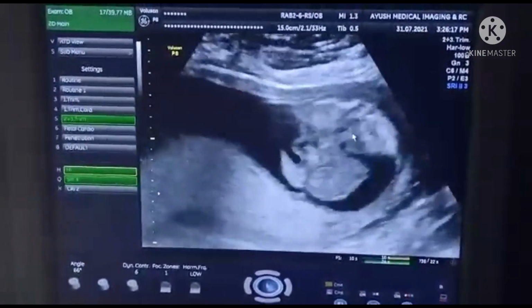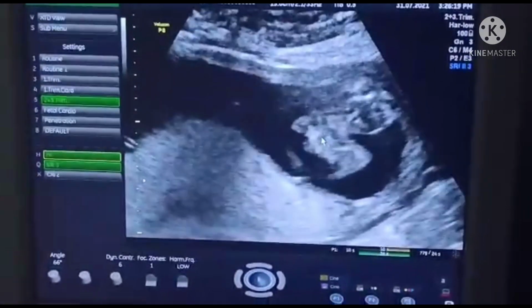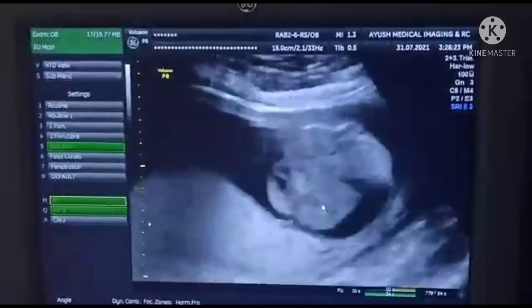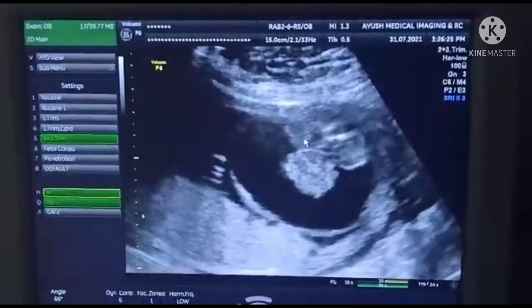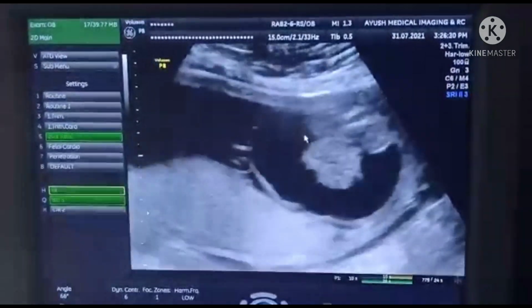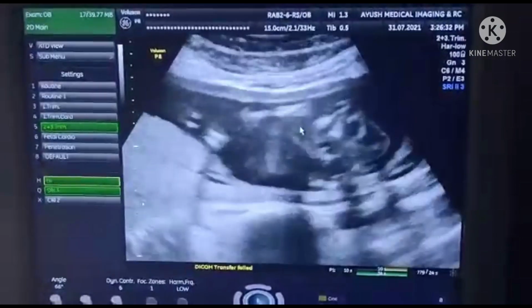This is a hyperechoic lung, this is the liver, and these are the bowel loops in the fetal ascites, and these are the fetal kidneys in the retroperitoneum, and the whole abdominal wall is thinned out due to the gross ascites.